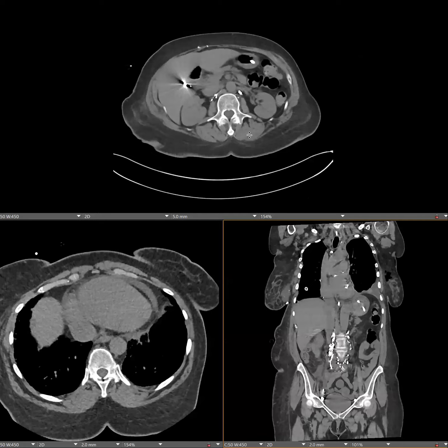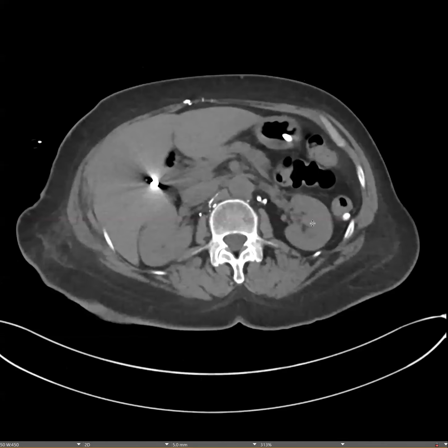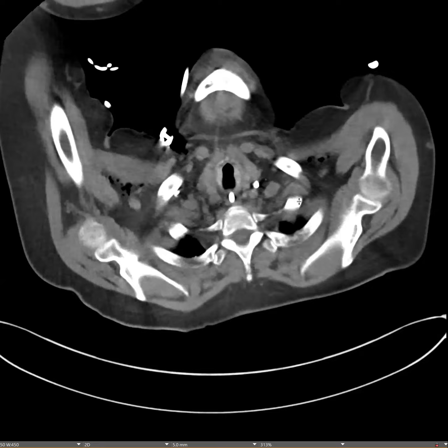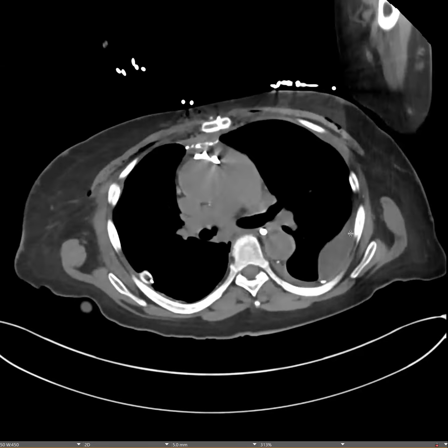So this was a good example. Do you know why they had a chylothorax? It's usually post chest surgery or trauma. They had some procedure, and following that had a thoracic duct injury in the neck, and that's why she had a chylothorax. Some procedure-related thoracic duct injury, iatrogenic.